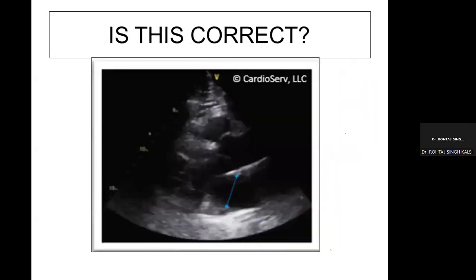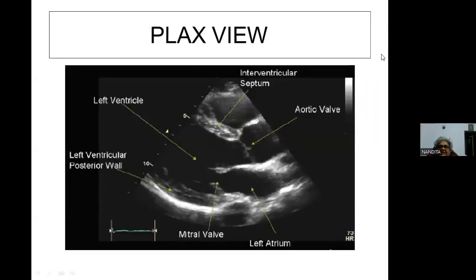Yes. Okay, focus your eyes. I'll first take this up. Focus your eyes on this line. Can you see this line? Yes, it's a thick line.